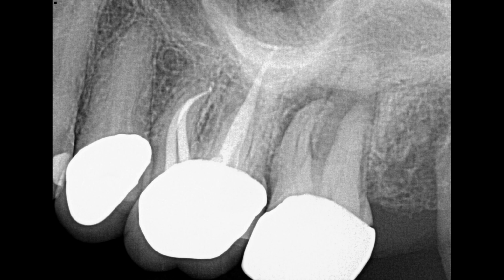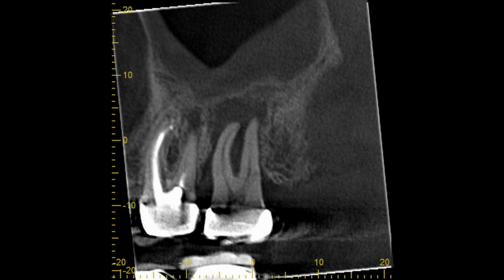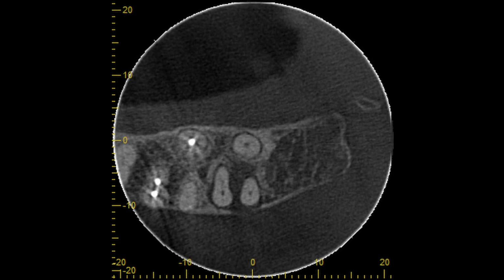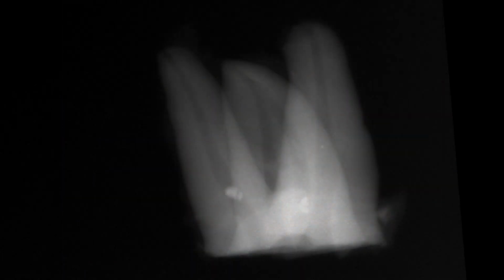This is Reed's case number 640. We're going to use the stitched image approach in analyzing it in the hopes it stimulates you to use this method for looking at the case. These are his cone beams. It's obviously a necrotic tooth. He did cut the crown off, which was nice because it got the formalin in the root right away.